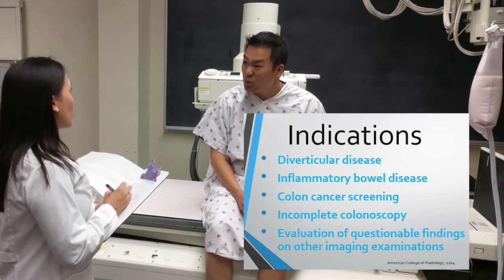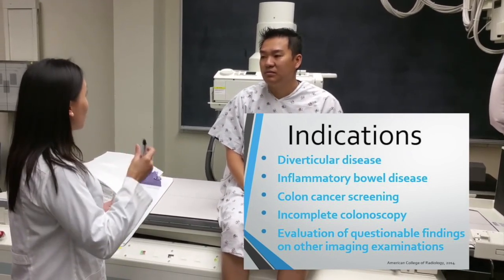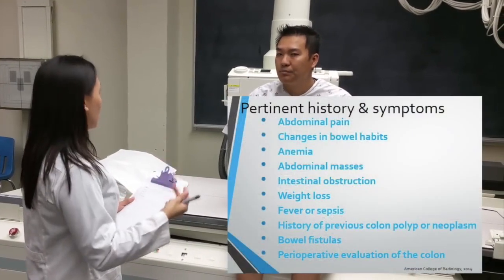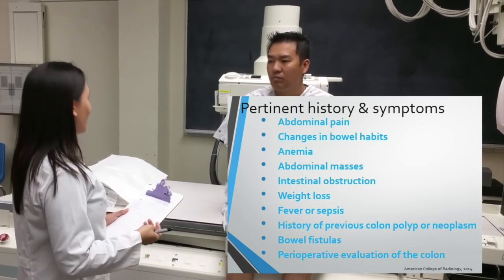Here's a list of common indications you're probably already familiar with. This exam has potential in helping to diagnose pretty much any disease that's intrinsically or extrinsically affecting the colon. Make sure to document any pertinent history or patient symptoms. Changes in bowel habits may include hematochezia, diarrhea, or constipation.